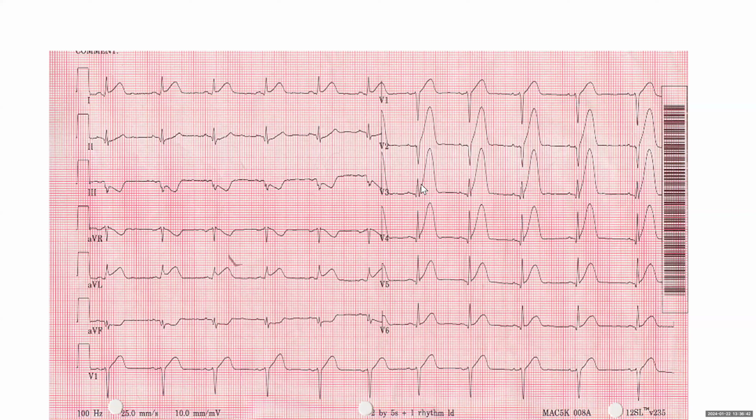Two, the ST segment is pulled, as if the T is pulling the ST segment. You get that sense. This is usually just before you get the ST elevation. And then someone else commented on the reciprocal changes in the inferior leads, which is excellent. Which wall reciprocates to the inferior leads? I mean the ST depression, yeah, lateral. Correct. Not anterior. Sometimes people say reciprocal changes from the anterior. Anterior do not reciprocate. Good. Excellent. Next ECG.